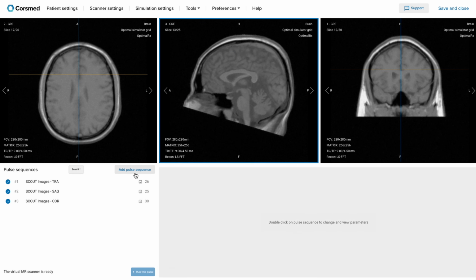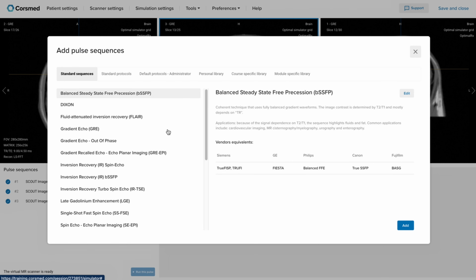Now, let's move on to the protocol overview. However, I want to point out that there is no single right way to perform an MRI protocol. The setup I will present next is a generally good setup that will work well for most cases, but your organization may do it slightly differently. You should therefore always check if your organization has any specific guidelines for performing this protocol. And if they do, make sure you follow those specifications.